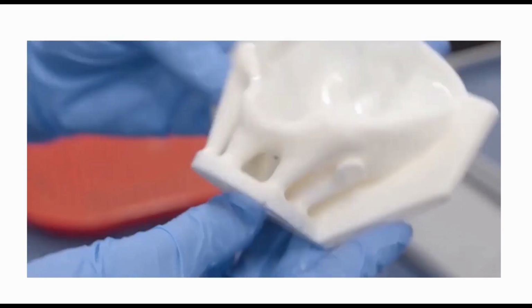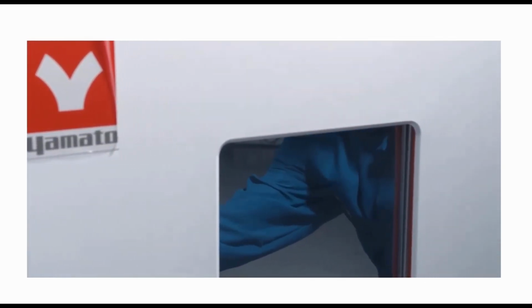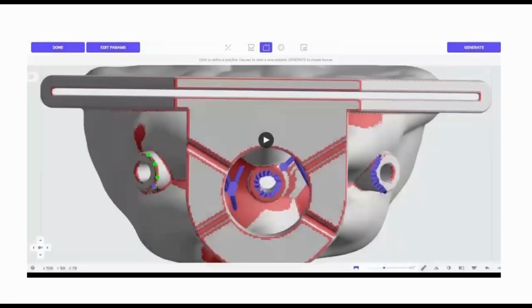Once we're finished with that, we're ready to bake the parts. The parts will go through this thermal cure step, and once they're finished baking, we'll have our finished part. This part is now ready for inspection, sterilization, and packaging.